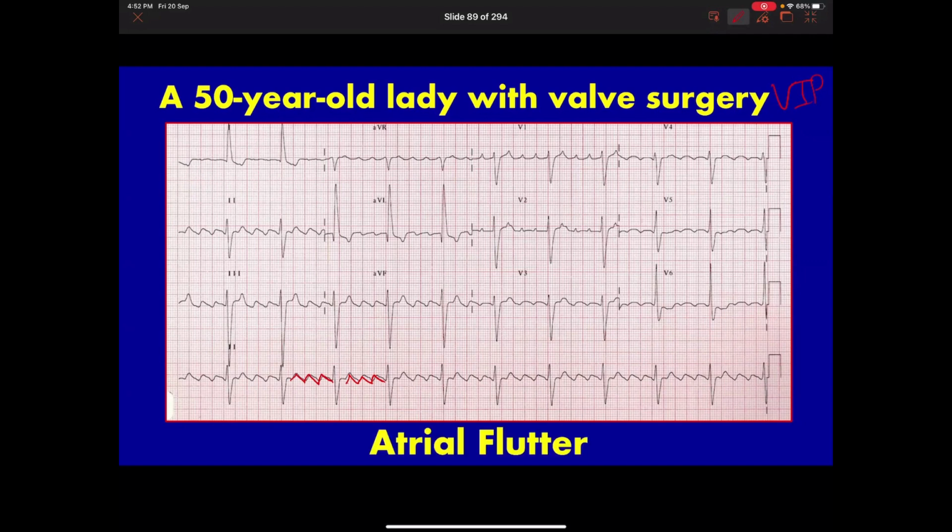So if you want to follow the table when solving this, you can. But it's difficult because when I studied this the first time and I applied the table, I got lost because I was like, this isn't tachycardia. Like it's like 5 squares. You know, how is this tachycardia? But atrial flutter is considered tachycardia because the atria themselves are fluttering. They're not even contracting fully. It's just like half a contraction. It's barely contracting.